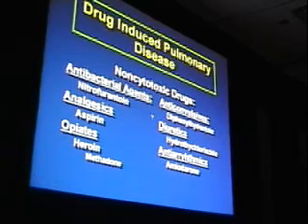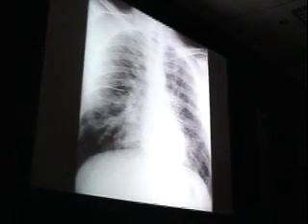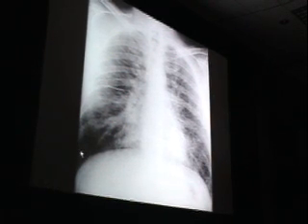Now, just keep in mind that drug reactions can manifest themselves as interstitial lung disease. And here is an example, in this case, methotrexate lung, the diffuse reticular nodular pattern, very prominent septal lines as seen in this case. Again, really, I think reflecting an underlying edema. But again, when you see prominent septal lines, keep in mind, we talked about interstitial pulmonary edema. Also, methotrexate or drug-related things do that.